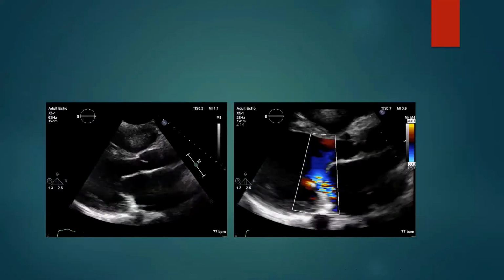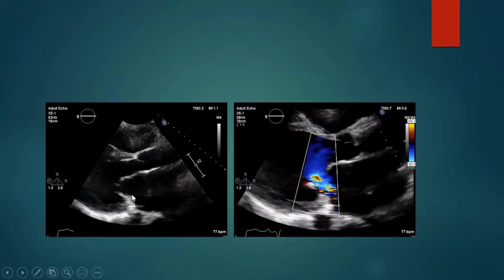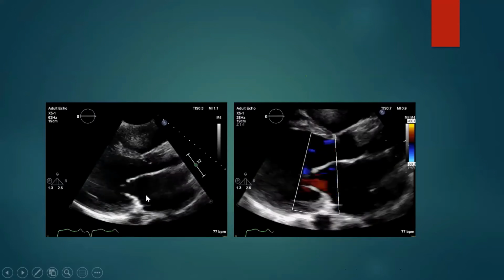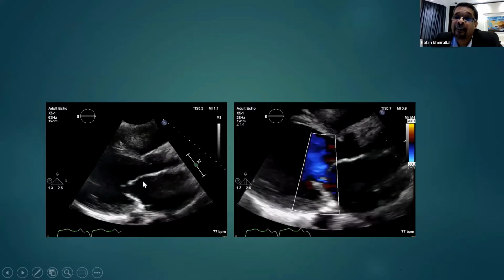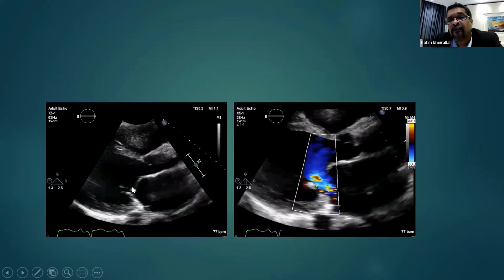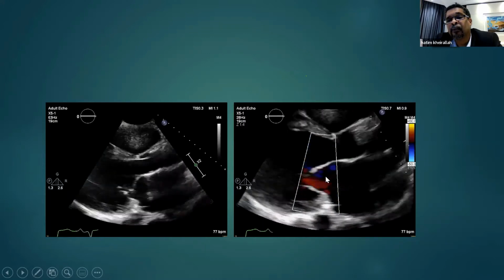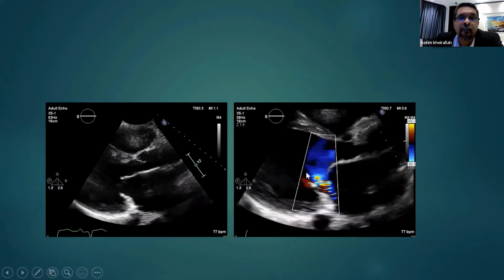Right. Because you don't see it well. No, I think it was okay. I don't know. It was no problem. There was, if I'm not mistaken, a prolapse of the anterior leaflet. Yes, it was. Fikri thinks that there is prolapse of the anterior leaflet with severe eccentric MR directed posteriorly. Any objection or support?